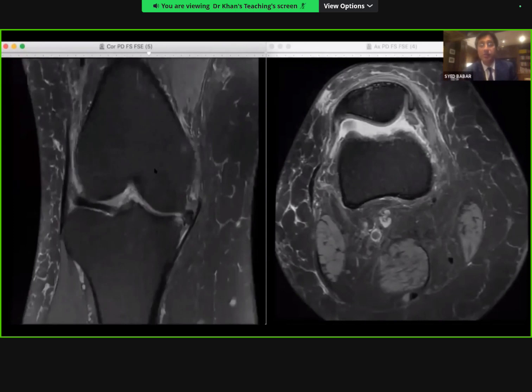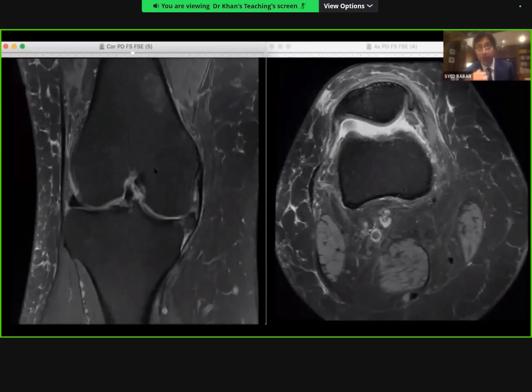So that then brings us to the quadriceps tendon. So quadriceps tendon ruptures, you must do an ultrasound, because remember, it'll give you an idea as to whether the central bit of the tendon is involved, or is it the vastus lateralis and medialis which are coming in. Most often you disrupt just one bit. Sometimes it's the vastus lateralis, sometimes it's the vastus medialis. Unless it's a transection injury, then you rupture the whole of the tendon. Just by twisting, it's very rare to rupture the whole of the quadriceps tendon.